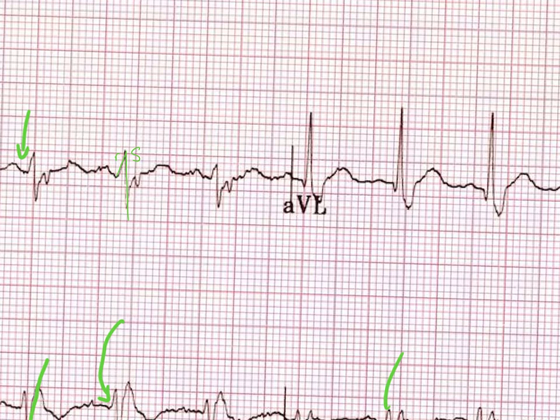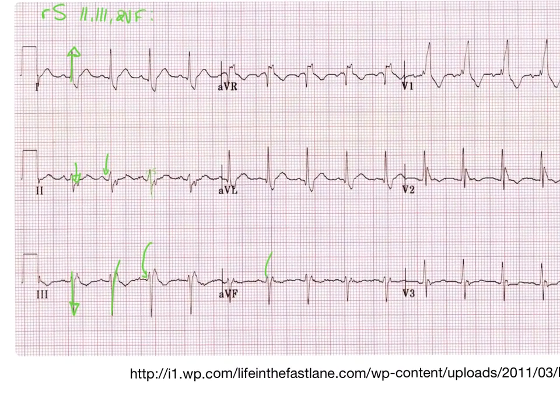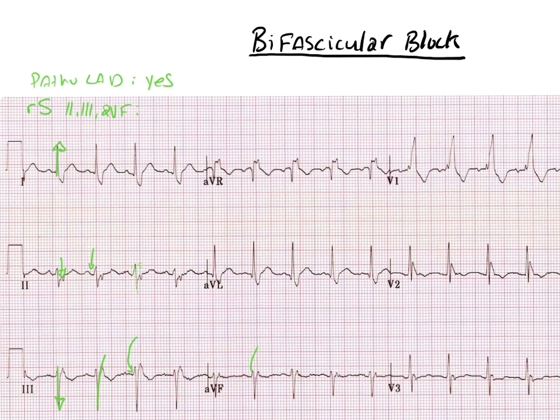Yes. I was thinking like each side, the top half. Does that make sense though? Okay, cool. So maybe a little more subtle there, but I think we'd all agree. So we'll say yes.